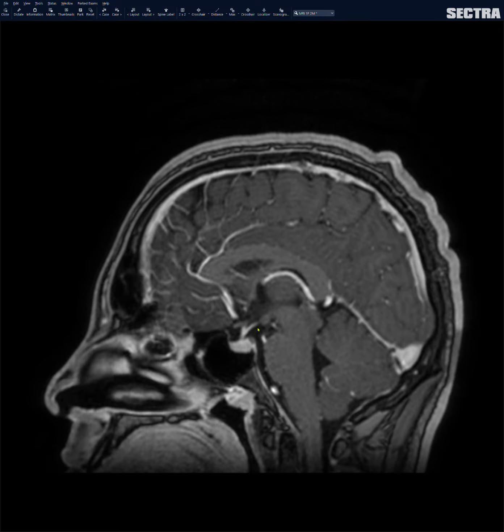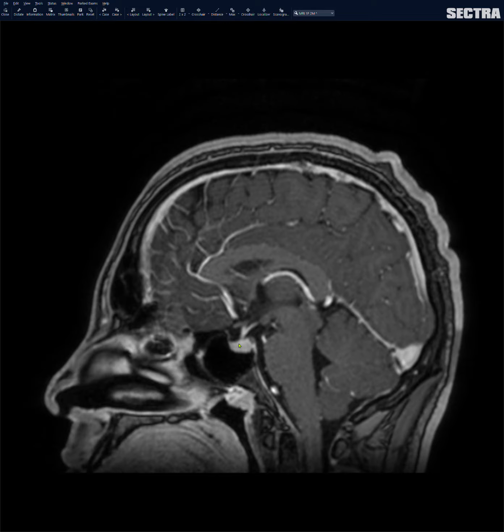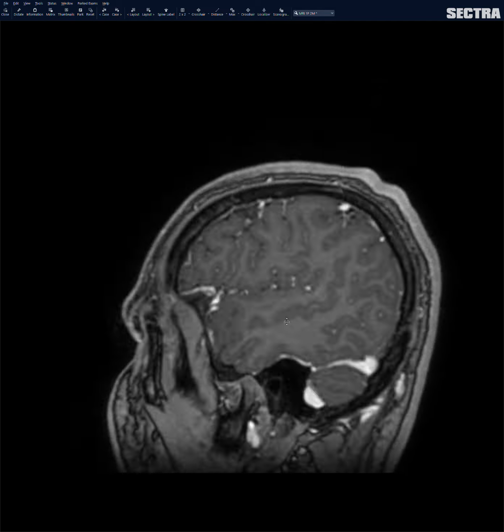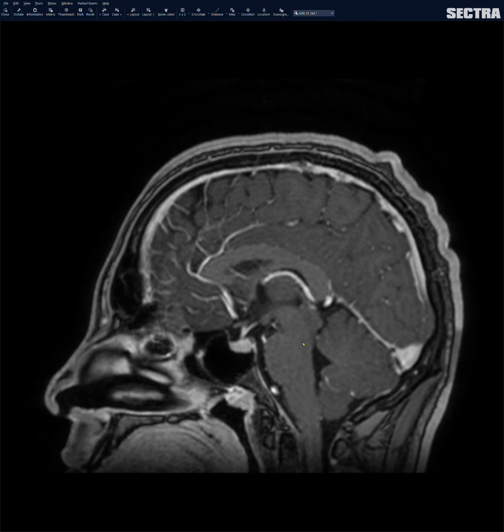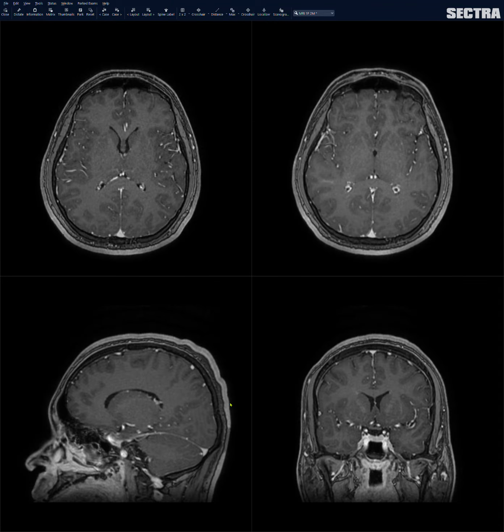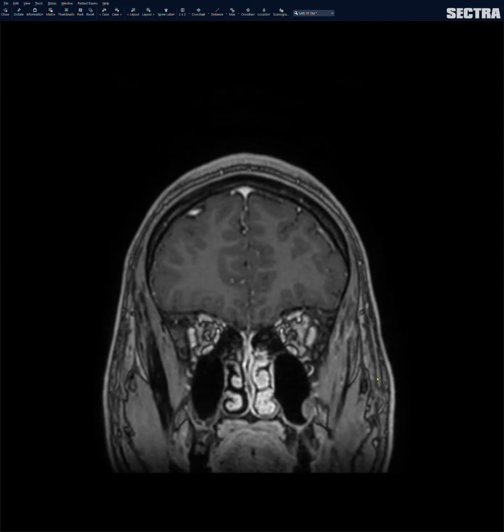And I always take a careful look at the pituitary gland and the sellar and parasellar regions for any kind of sellar mass, such as a pituitary adenoma. And then I look around for any kind of abnormal enhancement, and I take a quick look at the clivus and at the upper cervical spine for abnormal enhancement. Great. Coronals, usually, I just look through this really quickly because I already looked at the same data in axial and sagittal. So I just take a quick look, make sure I don't miss any kind of abnormal enhancement, and then I go from there.